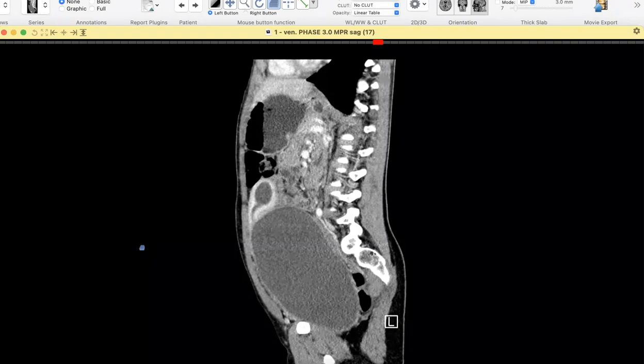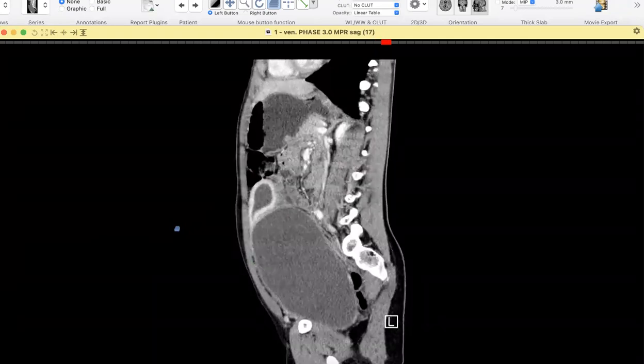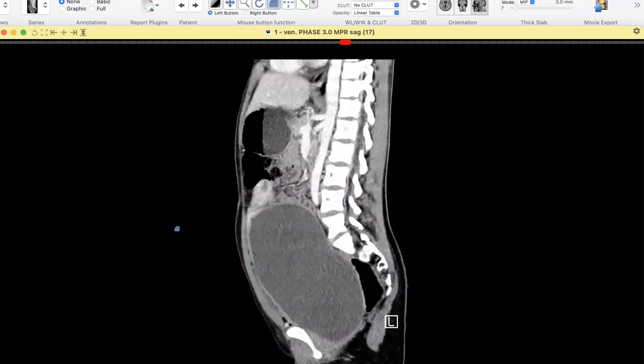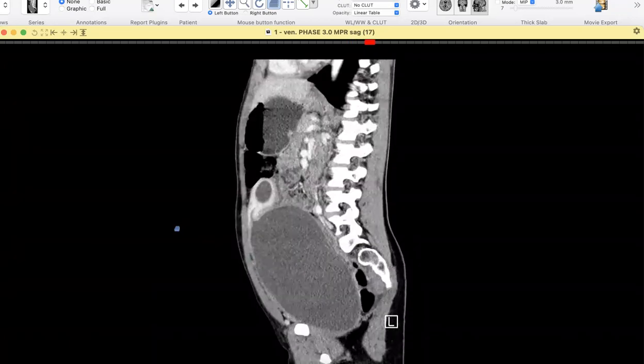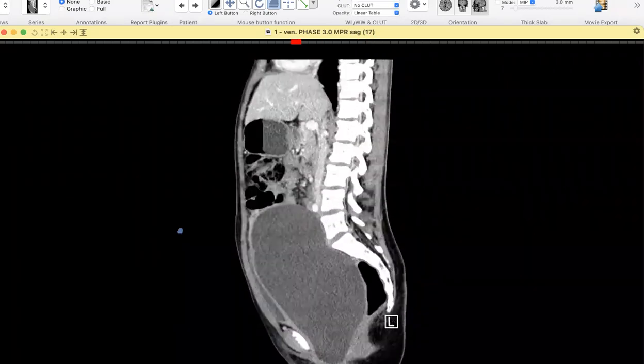Ectopic endometrium, maybe endometrial cyst. It could be. So what structure do you think this is? Maybe that one is the uterus, and these are all big cystic lesions from the ovaries. Because it is very huge, I can't. Maybe because that one is enhancing, it could be endometrium and the cyst within the lumen, and these are huge adnexal cystic lesions.